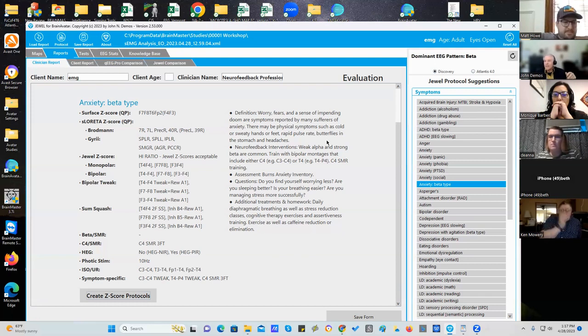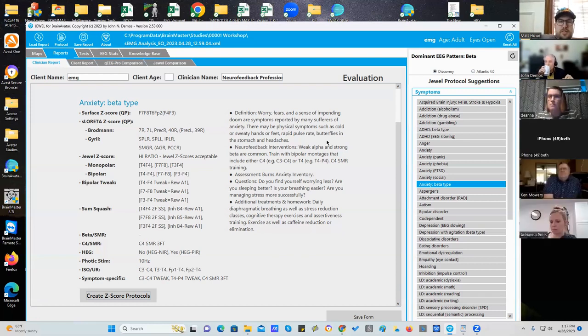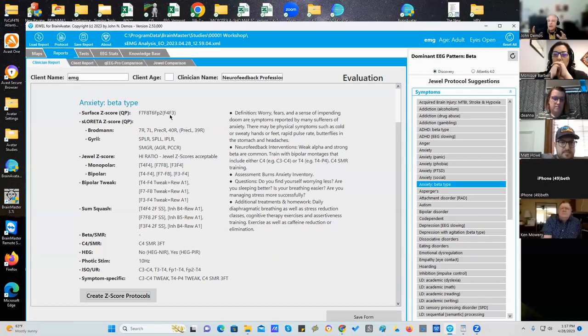Matt, excuse me. Is there a recommended progression of where to start with a protocol, or is that just over time and experience? So in general, if I have a client that does not have a severe anxiety disorder, I'll use Z-score training. But if they have PTSD, I'm going to be using, for example, let me just click PTSD.